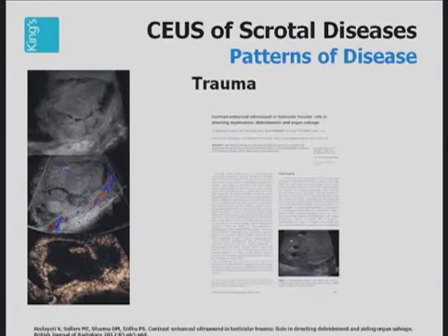In this example of a patient with a fracture across the testes, with a surrounding hematocele, with color Doppler ultrasound not completely demonstrating the vascularity of the testes, the addition of contrast-enhanced ultrasound will demonstrate that there is no viability present in that testes except for a very small area at the upper pole. This testes will not survive. An operation early on in the period of management of this patient will benefit the patient.